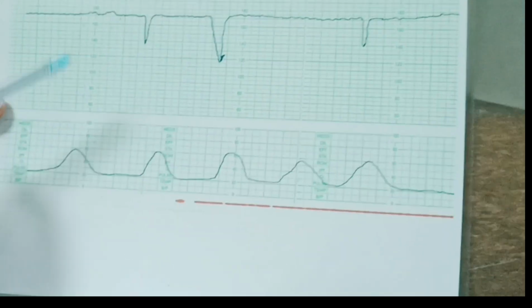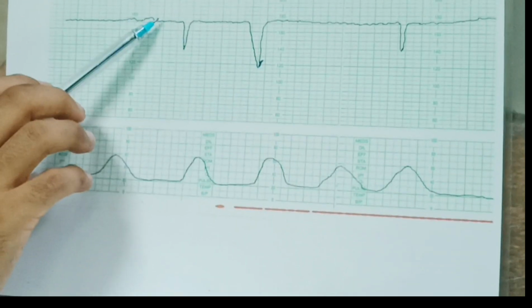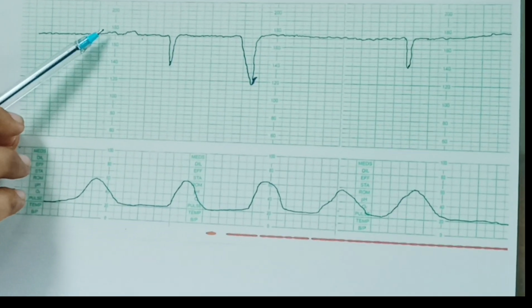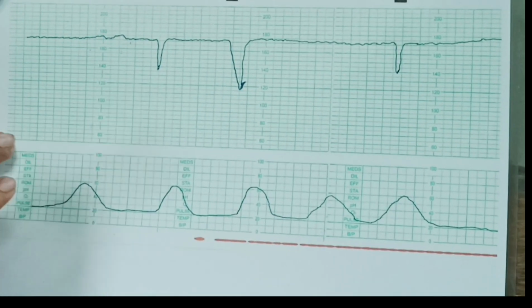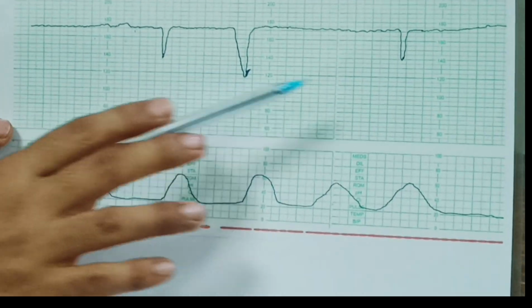Coming to this stretch, this is a cardiotocogram showing baseline fetal heart rate of 170 beats per minute. Now properly see, this is tachycardia. So 170 beats per minute will be non-reassuring. Then variability is also reduced, less than 5 beats per minute is also non-reassuring feature. There is no obvious acceleration and there are 3 decelerations.